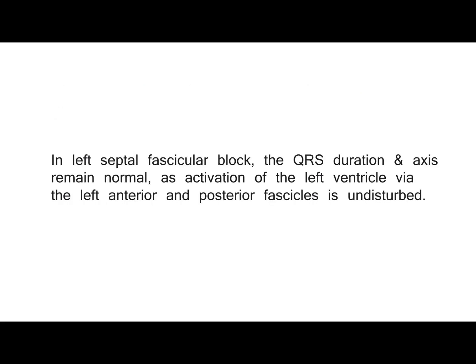In left septal fascicular block, the QRS duration and axis remain normal, as activation of the left ventricle via the left anterior and posterior fascicles is undisturbed.